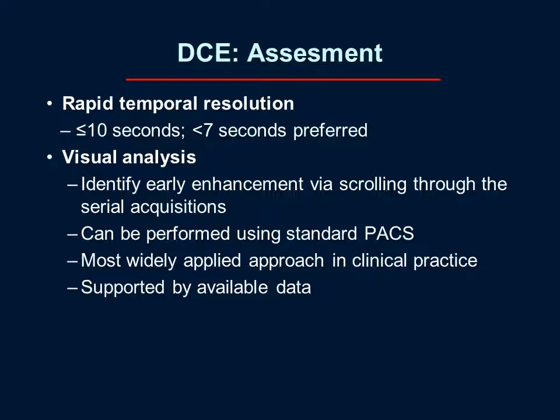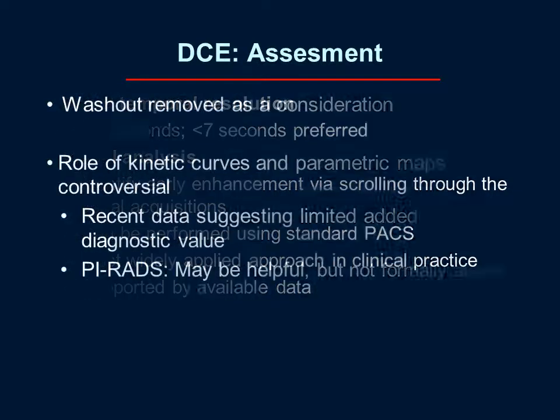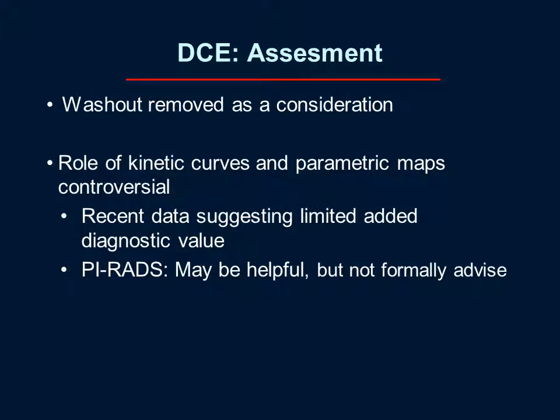So this visual approach is probably the most widely applied approach in clinical practice for evaluating prostate DCE, and is supported by available data on the topic. Note that washout has been removed as a consideration in most recent interpretation schemes in comparison with some earlier literature on the topic.